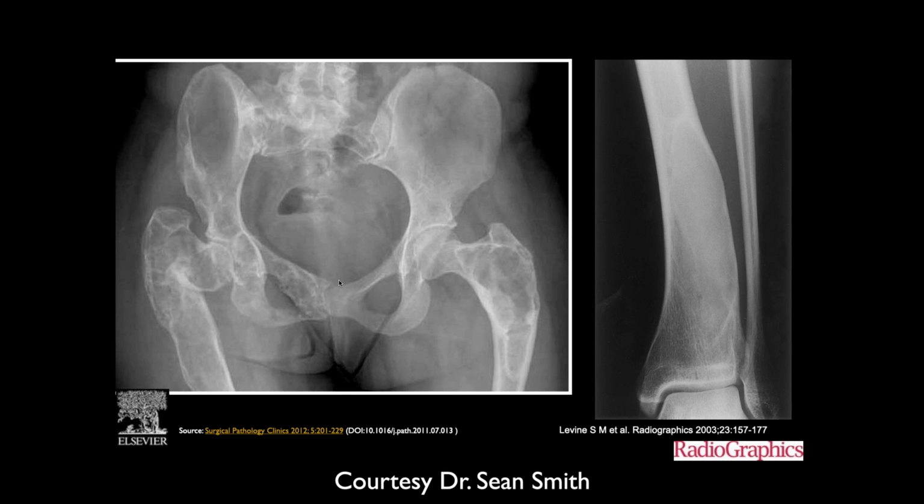On a radiograph of the pelvis, we have numerous lytic expansile lesions throughout the bilateral femurs, causing bony remodeling and abnormal appearance, and throughout the entire right pelvic bone and the right sacrum as well. There's also an expansile lesion in the distal tibia. So I'm worried about a congenital condition with multiple areas of fibrous dysplasia, like McCune-Albright. This is fibrous dysplasia.